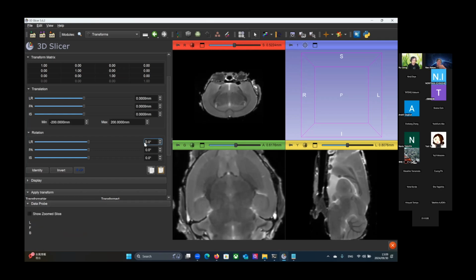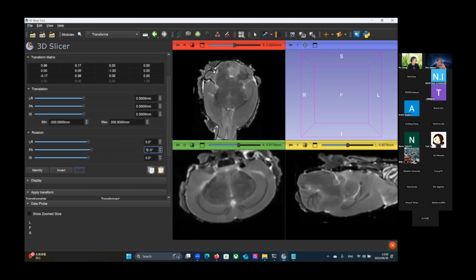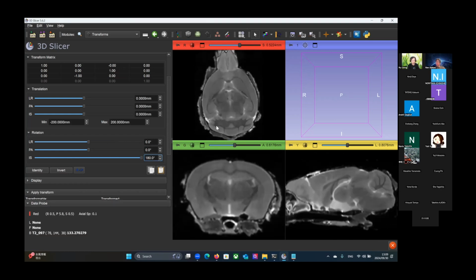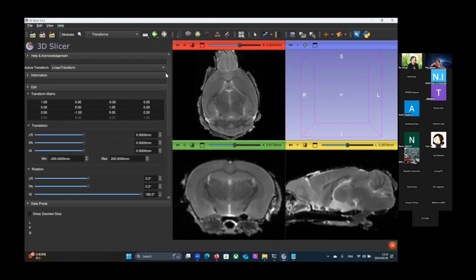So first we need to rotate this, right? So this is basically manipulating meta information about NIfTI, right? We are applying a transform matrix. And my question is whether 3D Slicer is compatible with the meta information of the NIfTI file. The NIfTI file also contains this orientation information, and whether it properly reads it.